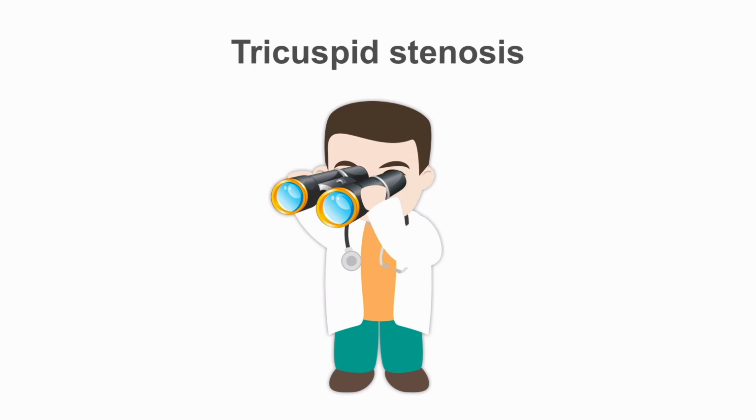Now let's think about tricuspid stenosis. It's very rare. But not only is it rare, it's actually really difficult to spot as well. It's mostly going to be rheumatic, but you don't get the thickening on the tricuspid valve that you see on the mitral valve. So if you have rheumatic mitral stenosis, don't forget to check the tricuspid valve quite carefully. Occasionally, a pacing lead through the tricuspid valve can become enmeshed in it and cause the valve to become stenotic. So suspect tricuspid stenosis if your forward jet on colour looks narrow and if the mean gradient is more than 2 when you trace around the forward signal.